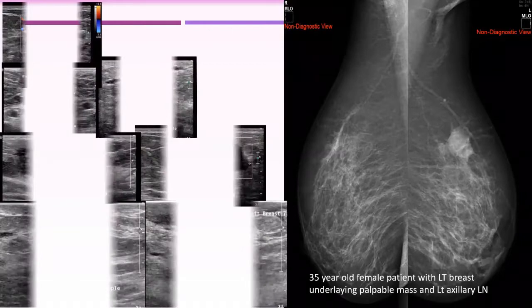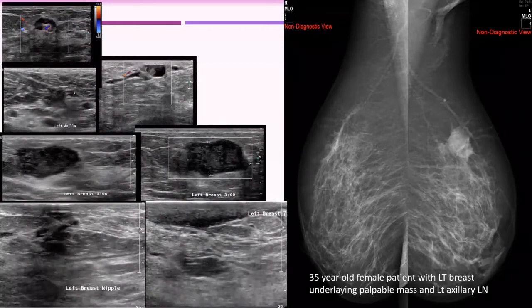You said you want to do ultrasound. This is ultrasound. Now, could you see the lymph node or not? Yes, the lymph node shows focal enlargement of the cortex. Focal or diffuse? On the right one it is focal, and on the left one it is diffuse thickening of the cortex.